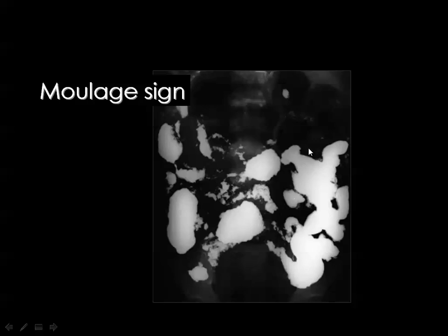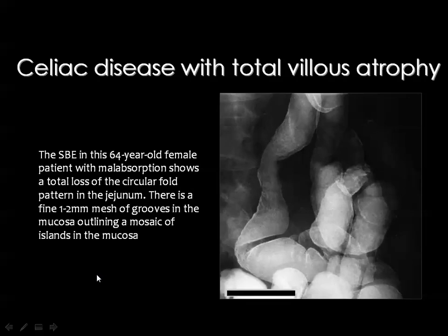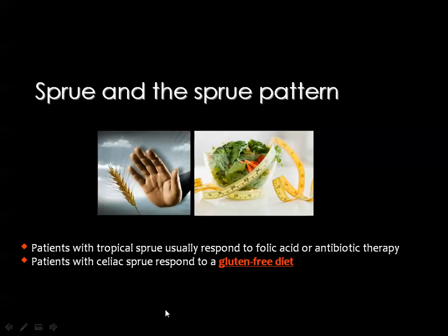You get segmentation and interruption of the flow of barium through many of the bowel loops, so you cannot judge the caliber, you cannot judge the presence of strictures and so on. Then this is the end of the story, where you can see that the small bowel loops, the mucosa is totally effaced, and you may get some areas of stricture as well.